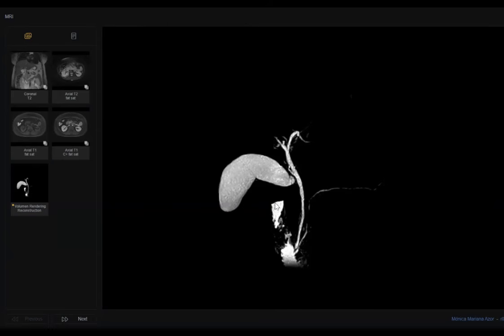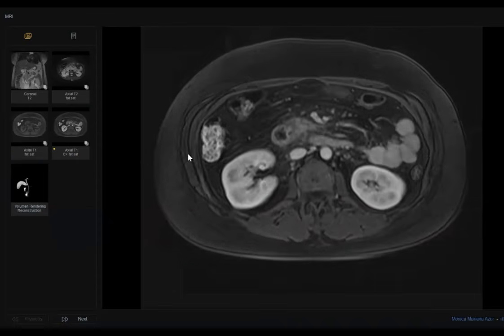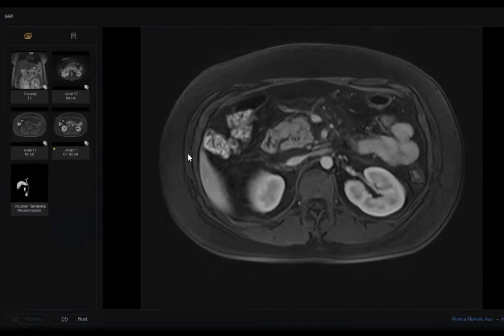This is the first part, and there is marked narrowing here. Why? Because the pancreas suffocates or stenoses this part. This image, this slide, is very sufficient to diagnose annular pancreas, or at least to tell the examiner the second part of the duodenum is stenosed, with attenuated caliber. Your next step is to look at T2 or T1, anyway, any of them. Look here in the post contrast.